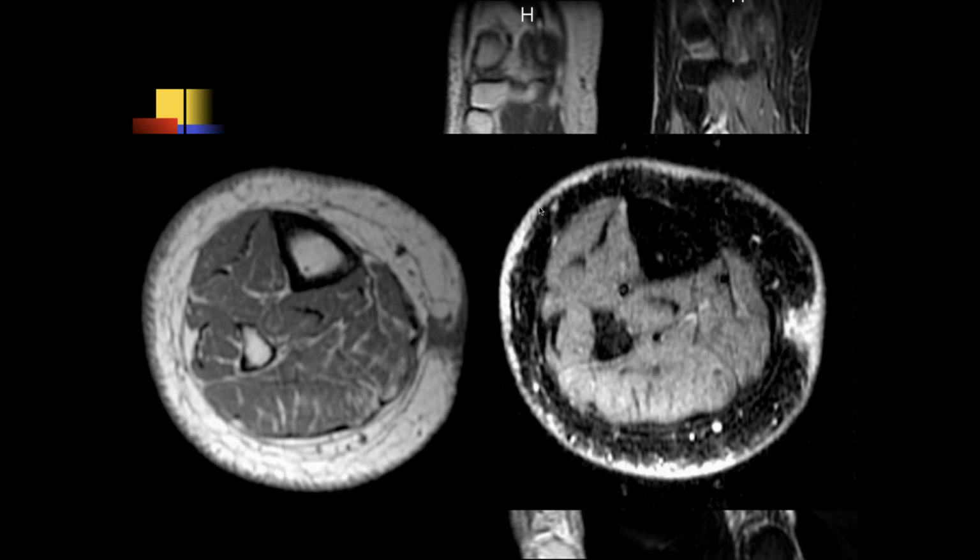And then there's a rim of superficial edema, which could be like a cellulitis or nephrogenic systemic fibrosis. This turns out to be a systemic fibrosis. I've never seen that. Where we saw a little bit of this in MR was when people in renal failure got high doses of the old gadolinium contrast agents, and you could get a fibrosis. That's what this is. This is actually a gadolinium reaction.